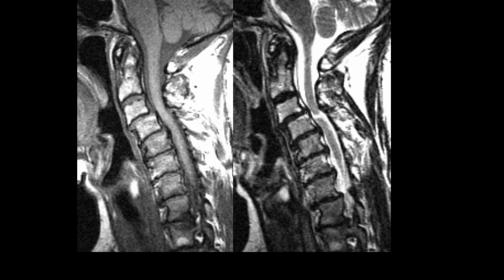So two sagittal images, anterior listhesis, C3 on C4, and multi-level disc protrusion with increased signal within the spinal cord. And we see that here. Generally, when you see signal within the spinal cord like this, it's highly associated with symptoms. Even though you don't see it on T1, we do see it on the T2 in this setting. And the cause for this is not exactly at a disc level. So why this has occurred is somewhat unclear, but there's obviously a lot of instability of the cervical spine here. So presumably it's some sort of traumatic injury to the cord caused by instability.